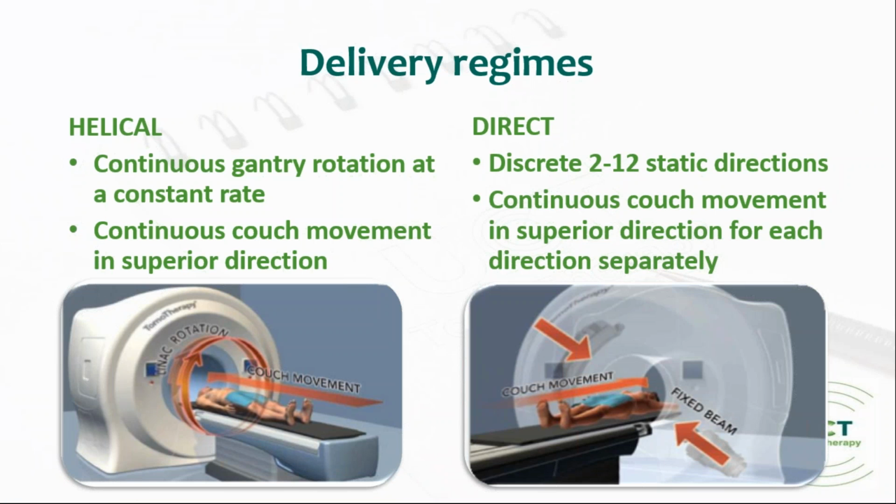I decided to make my plan in helical regime because it gives more freedom, more space. But usually the direct regime is used in our clinic for breast planning.